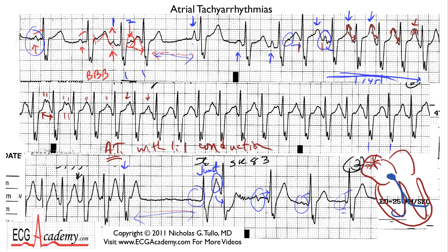down to the ventricles. In other words, these electrical impulses are originating in the top chamber, and they go down the AV node to the bottom chamber, and the AV node is not part of the circuit. In other types of supraventricular tachycardia, the AV node is part of the circuit. But that's an advanced topic, and we're not going to get into that at this basic level. At any rate, atrial tachycardia implies it's coming from the atrium, and the AV node is simply conducting the impulses to the ventricle. Now, I've shown you two examples of non-sustained atrial tachycardia.